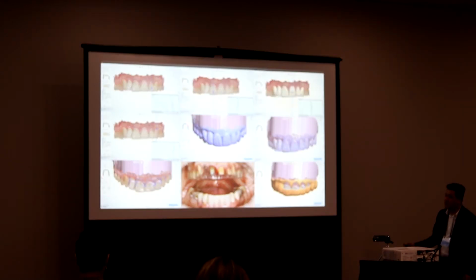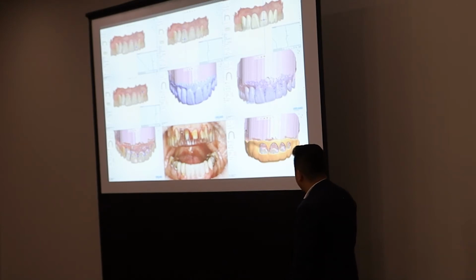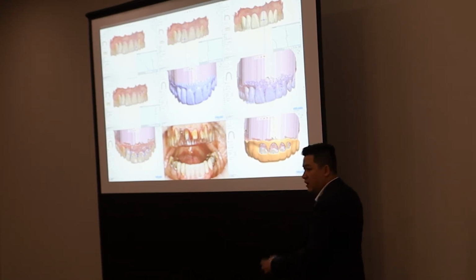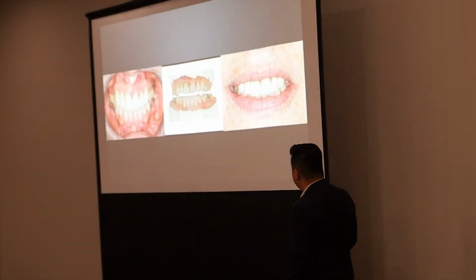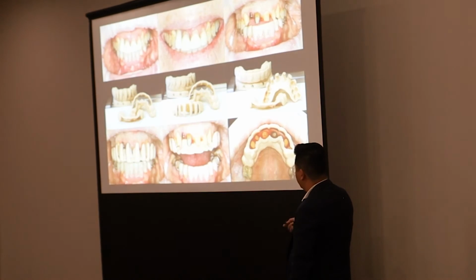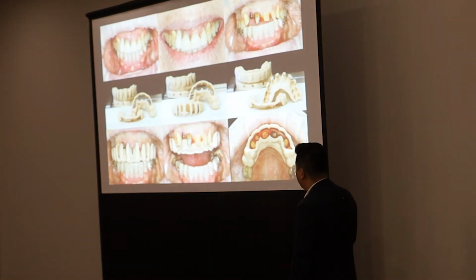What I used to do is make these out of the custom tray module, but I wasn't very happy with the margins and the finish line around these windows; they weren't very precise. So what I do now is cut these straight across, and then we'll just have the cervical third left, and we'll make a clear suck-down that the periodontist can use to follow and do a reduction, like a perio guide.